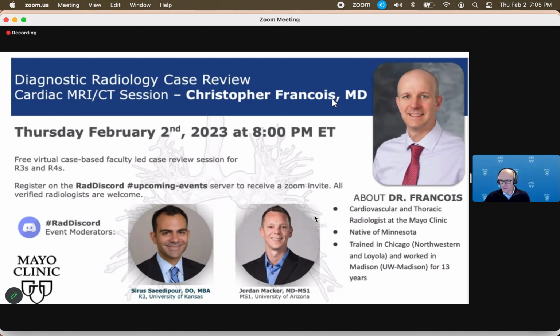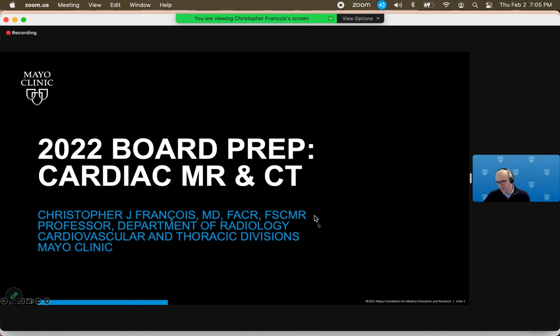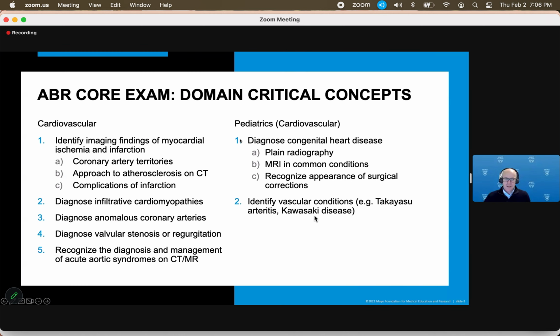All right, thank you very much for that introduction and for inviting me to share some cases. I'm going to be focusing primarily on cardiac MR and cardiac CT cases. I looked at this yesterday just to see if there had been any changes since last year.